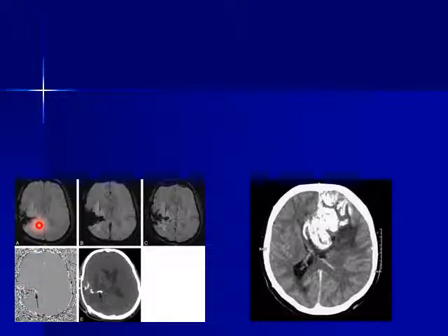We compare according to the system. Usually the calcification can give low signal or blooming, okay, while in the phase image it gives hyperintense signal. This is in the system which is called right-handed magnets.